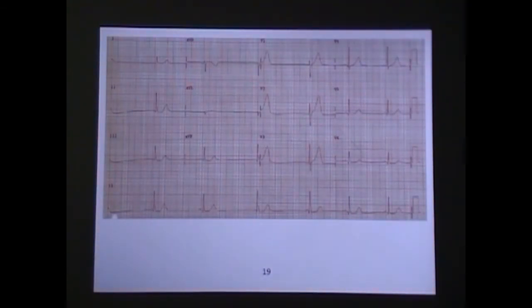To me, this is a junctional escape rhythm. We're not going to get PR intervals because the morphology of the P's with the QRSs are all the same, but there's some miscommunication at the AV node that's causing this, and only some are getting through. Really can't say much about this. Nothing really screams at me for attention besides that they're in a third, which is enough.